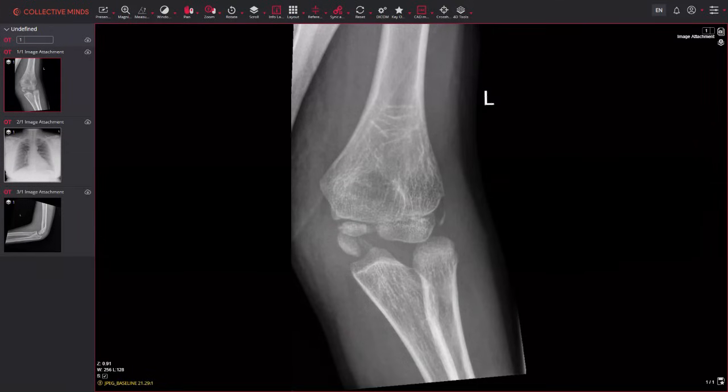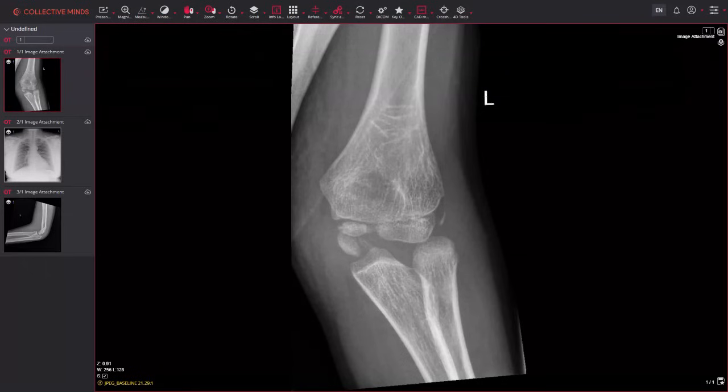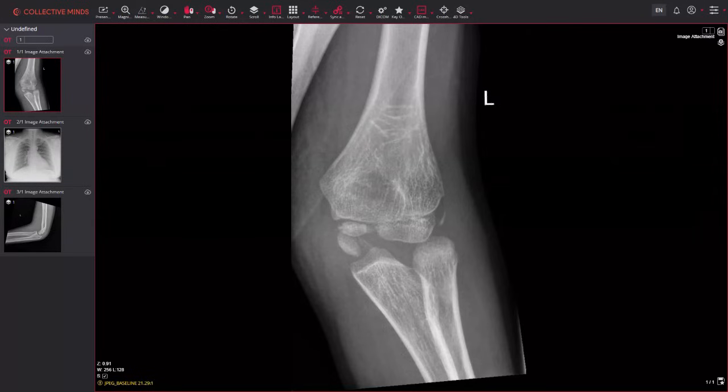The significance of if you have a laceration next to a fracture is called an open fracture. Basically, the significance is that if that wound is opened out, there's potential for infection to get into there, and for the patient to get a bone infection, which is termed osteomyelitis. So if the patient isn't given antibiotics, then that can develop and become quite nasty. So it's worth mentioning whether there's adjacent skin laceration. If there is, you can term it an open fracture, as opposed to a closed fracture if there isn't.